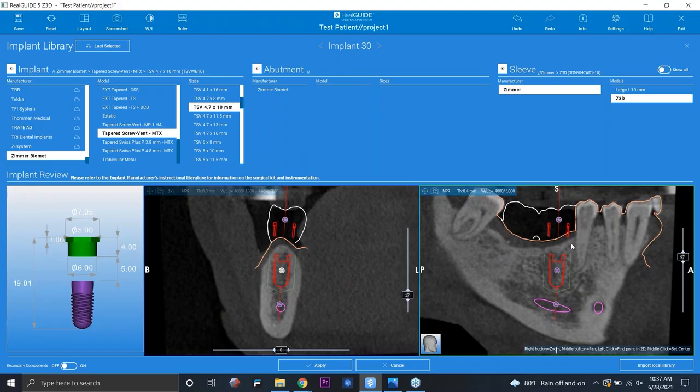So that is a couple of things to think about from the design aspect when you start having anatomy collisions and start planning the height of the sleeve. So for example, the surgeon would either have to keep this position and reflect prior to seating, or go with raise the sleeve and use a longer drill, which of course has its own surgical implications as far as, what is the patient's vertical opening that far posteriorly.